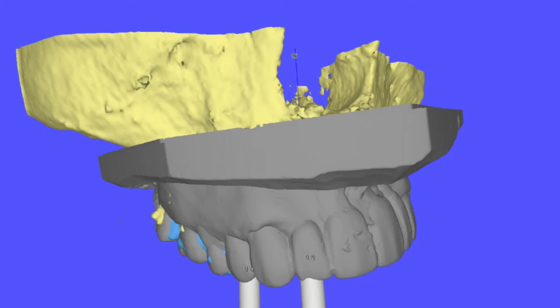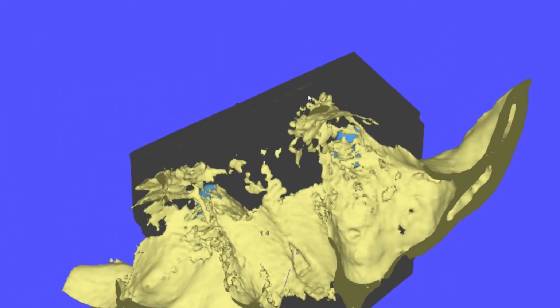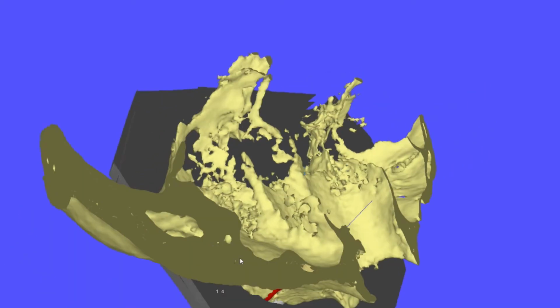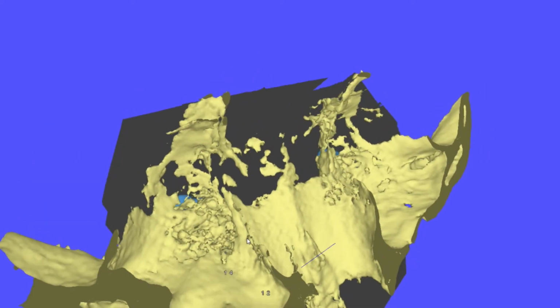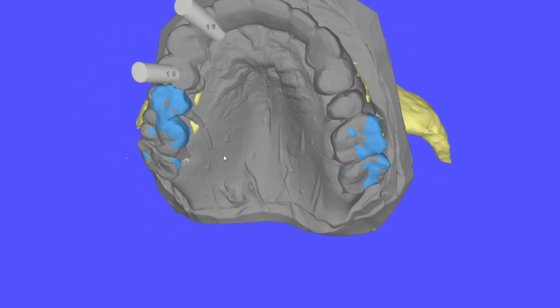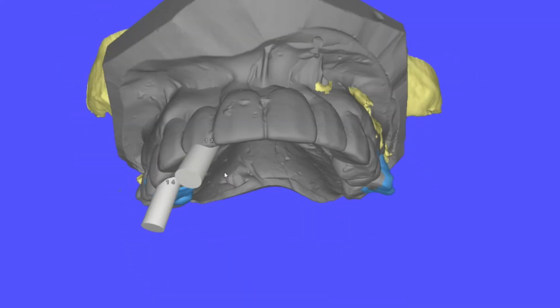And you'll notice the axis of the implant is also shown above here, and I can just tilt that maybe from there, and that would be moving the apex just that little bit further away from our incisive nerve. I can look down from inside the skull, and I can see there is no sign of the implant perforating the nose. I can see there's no sign of any implants perforating the sinuses. So now I am quite happy with this arrangement.